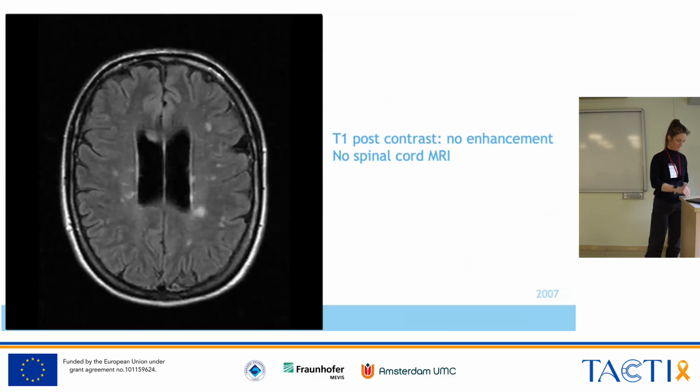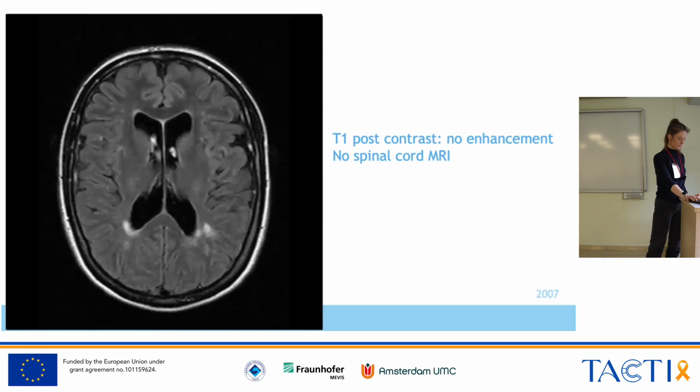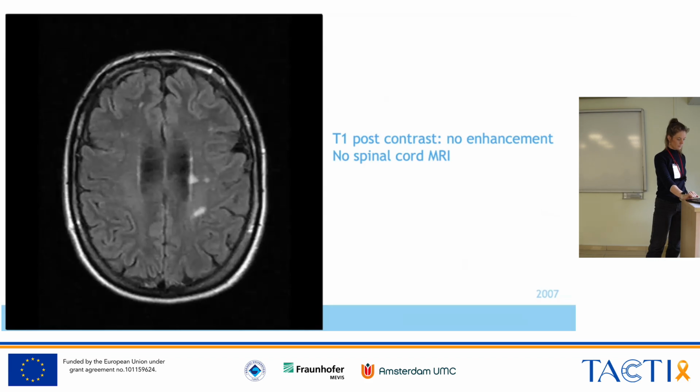So the lesions do not have a very nice round oval shape, really. They're more irregular, like you see long lesions, zigzag lesions, they have all kinds of shapes. So this is not MS typical. This is typical for vascular damage. However, if she's 49, then I still have to say that this is a lot of lesions for 49.